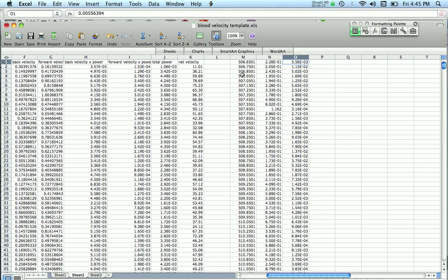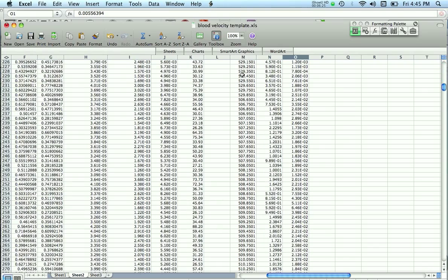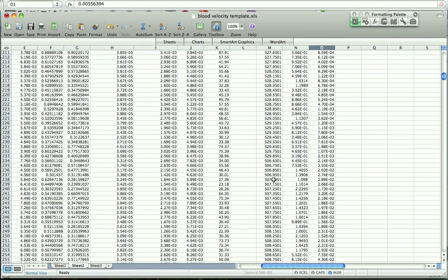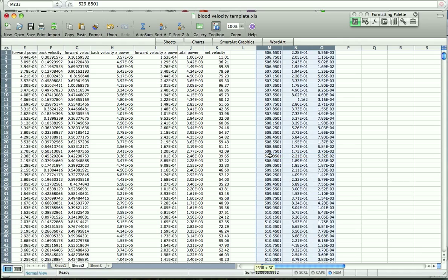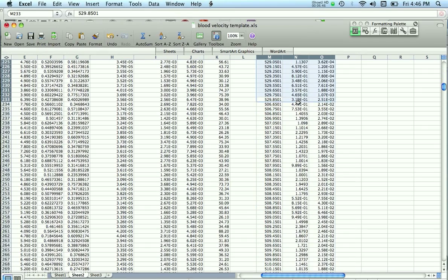We let this macro run for a series of times, so what you'll see is after about, I guess it was 20 seconds or so, you see the time return back to the beginning, basically where a cuff release was released. So you need this information, and you need to align this channel information with this information. To do that, you're just going to put them one beside the other.